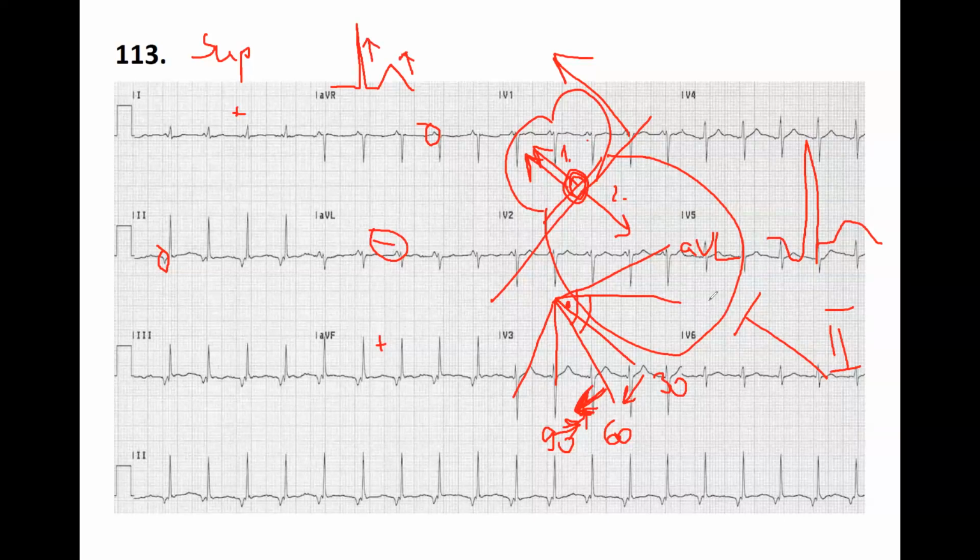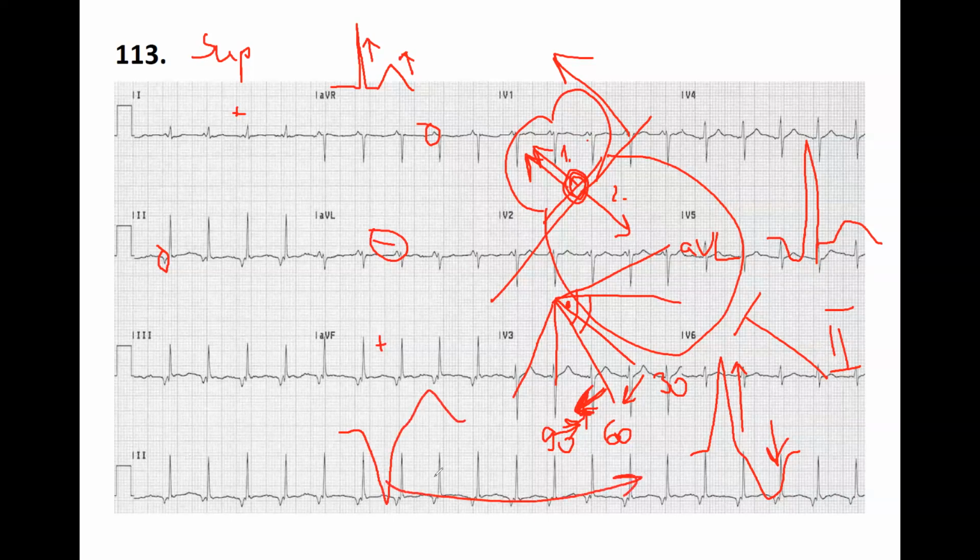If you have a ventricular one, you do have a wide QRS complex and an inverted T wave, exactly the opposite of the QRS. Ventricular can start the QRS negatively, but the T is opposite. These are both ventricular, and this is supraventricular. It can start here, it doesn't matter. It can start something like this, and that can be a supraventricular one because the QRS is narrow.